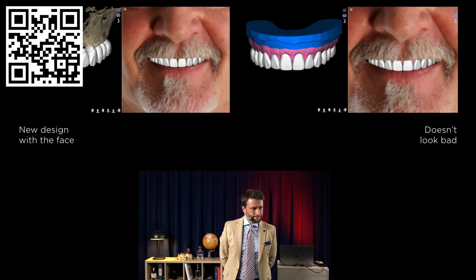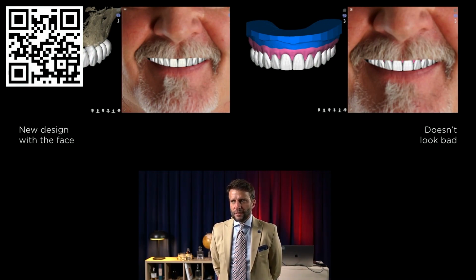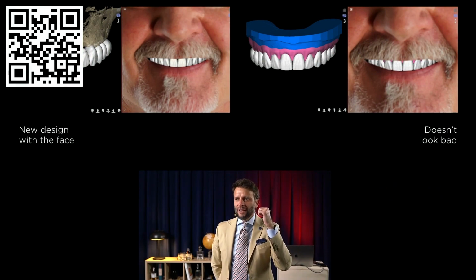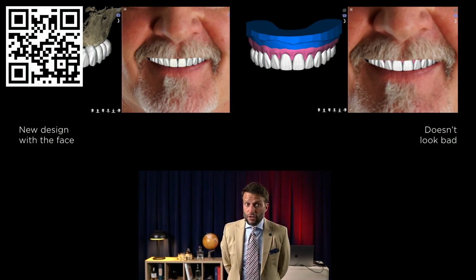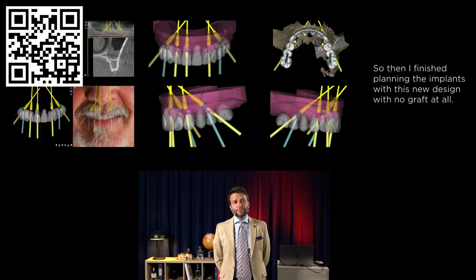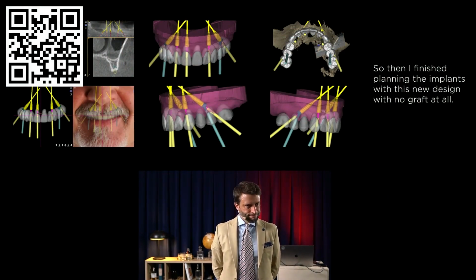It looks fine. Of course, at this point, if you're not sure about this design, what can we do here? We can print this in 1 minute and we can do a mock-up over his old denture. How cool is that? You do a mock-up over his old denture and you check with the patient if it looks good enough. Okay? If it looks good enough, we can then finish the implant planning, a much better implant planning with this new design.